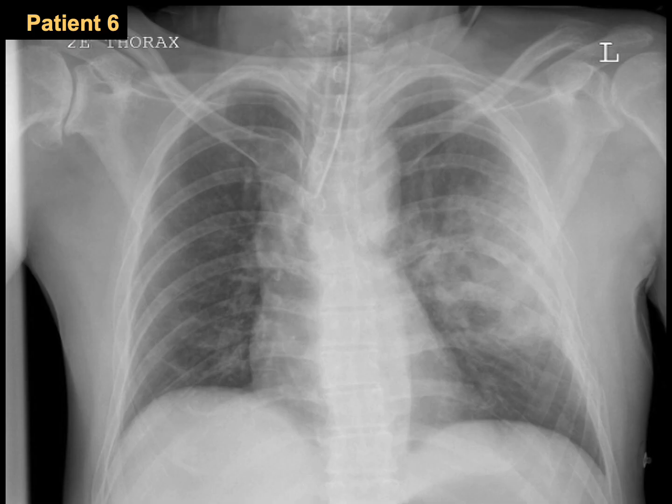Okay. Patient number 6, motorcyclist, head trauma on admission. Okay. Airway is a little bit more or less in the center, but actually there is a tube, endotracheal tube with the radio-opaque marking here. But I think all of us can appreciate that the tube is a little bit going to the right side of the chest. Sorry, the right main stem, and this is the airway. B for the lung. Okay, lung is okay. But when we go for the left side, well, there is some heterogeneous whitish opacity just in the middle of the lung.